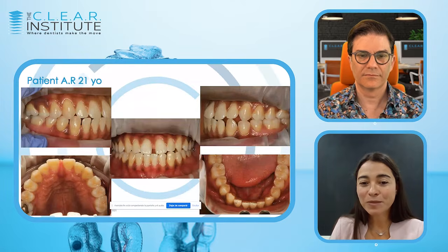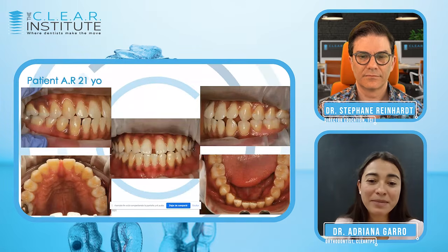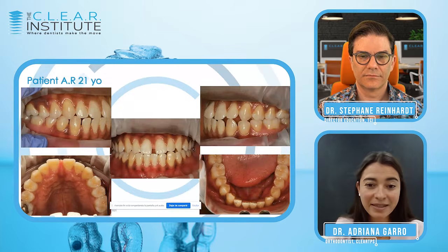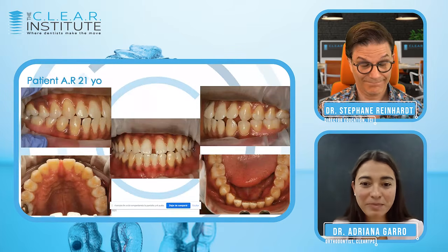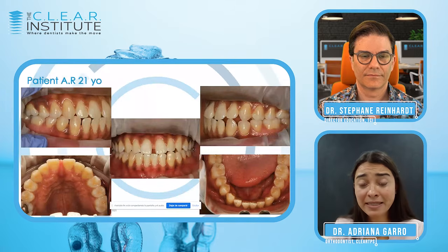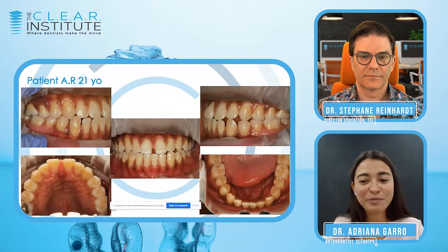So we are facing a midline discrepancy that is not a dental midline discrepancy, it's a skeletal midline discrepancy. Now we find spacing and an edge-to-edge bite. So we were right, he's a little bit of a class 3, isn't he?